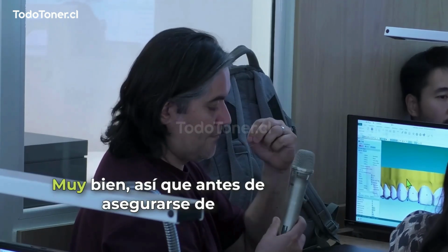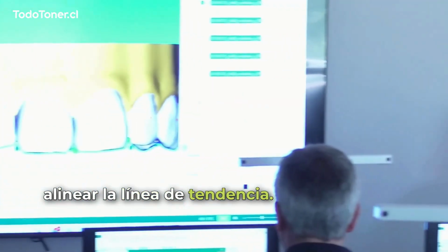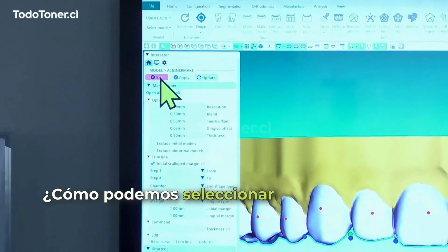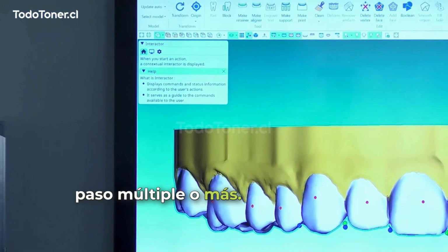Okay, so before we make sure of the aligner trim line, I will show you one more time how we can select multiple steps.